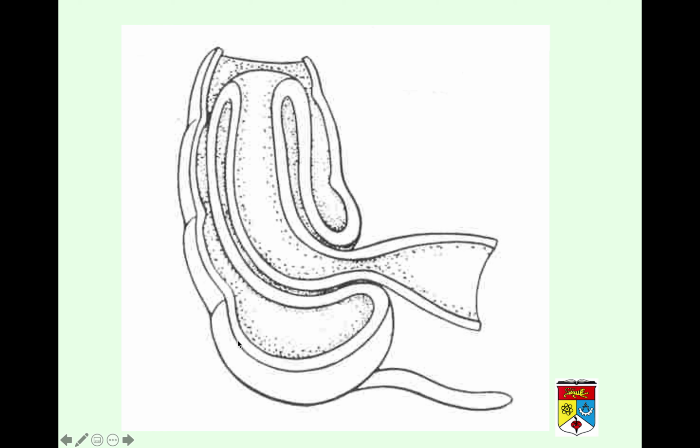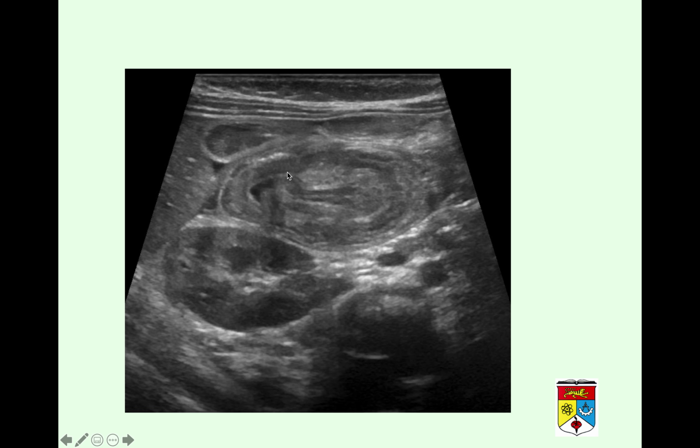So this is the cecum. Okay, that's the appendix. So the cecum is the recipient, the intussuscipient, where the ileum is the intussusceptum, and it telescopes into it, because the bowel is still immature, so it's mobile, and that's why the intussusception happens. As a consequence of this, it will create an intestinal obstruction. Okay, so when we do an ultrasound, most of the time you will see a bowel within a bowel.